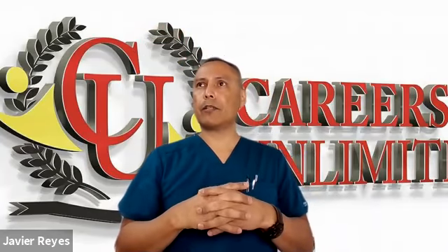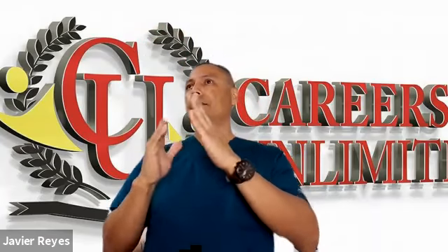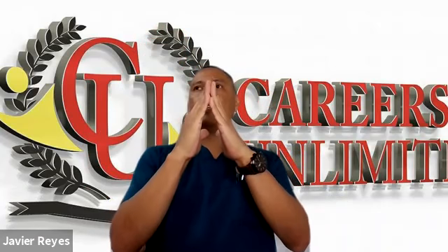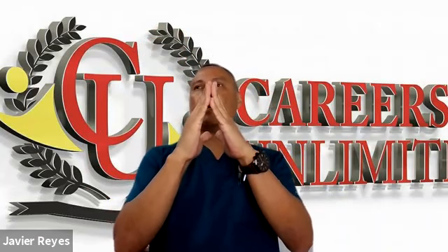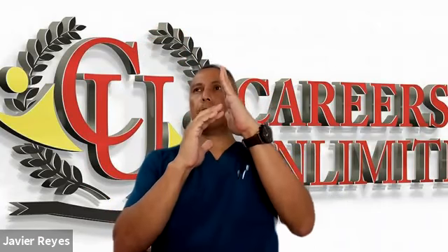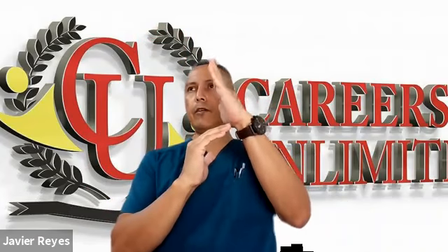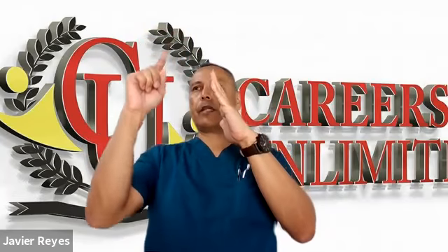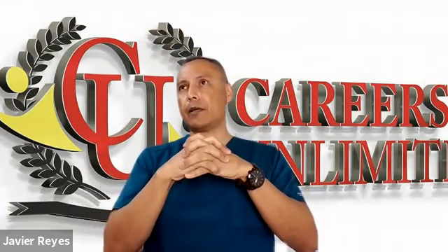Okay, right bundle branch will be on the left, if you're looking at the EKG and the R wave specifically. If you see an R, remember that's going to be your first upward deflection. Then you've got one down, S, and then R. That's going to be a right bundle branch block.